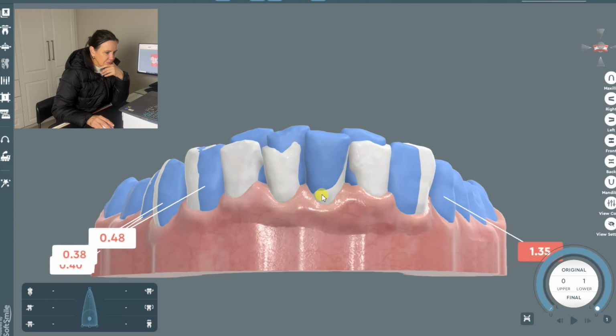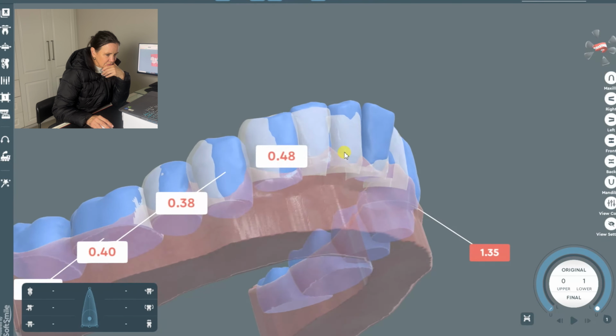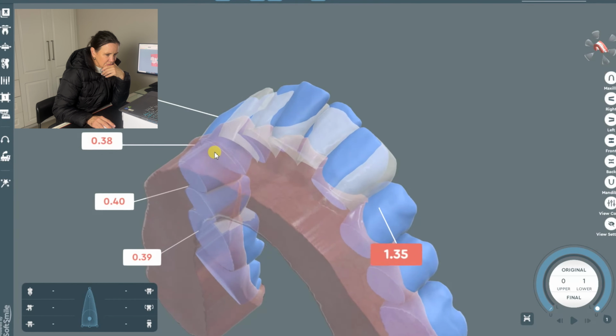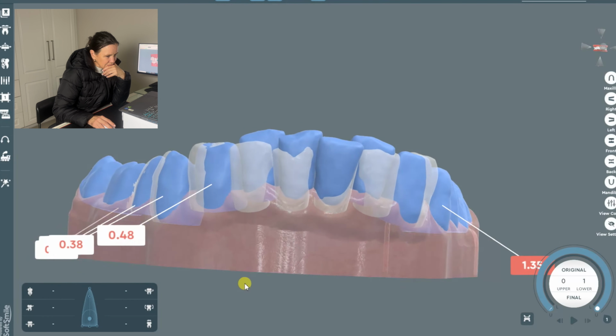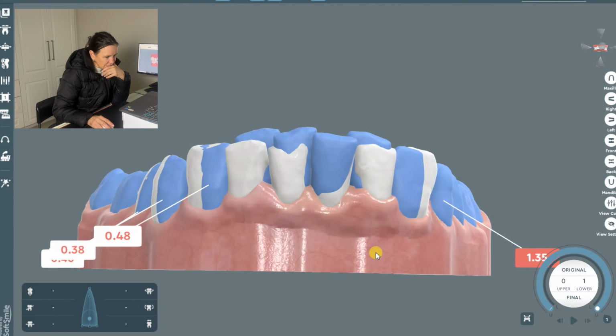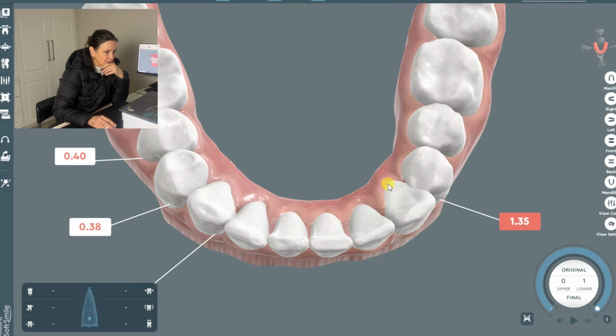That's the 3-1, but looking at that, I kept that position intact, so I'm happy with that.